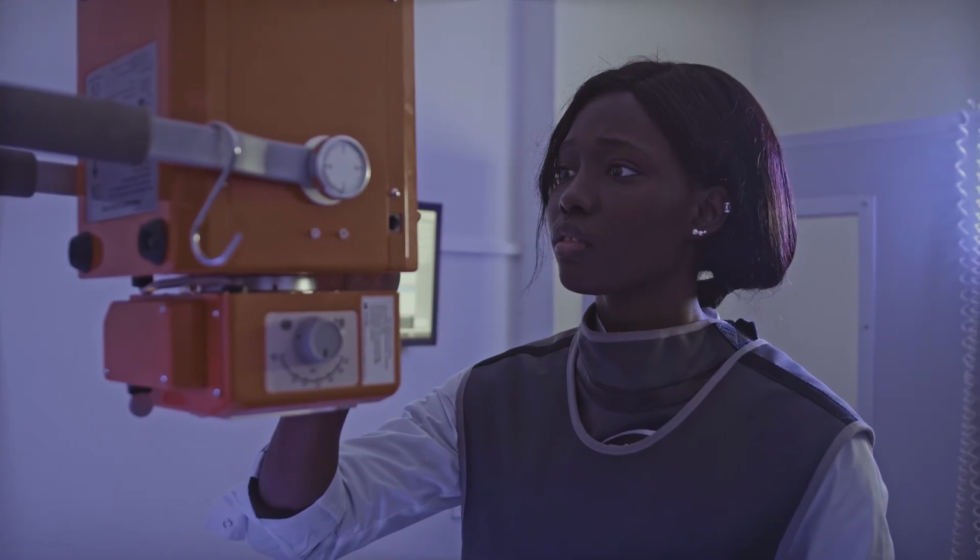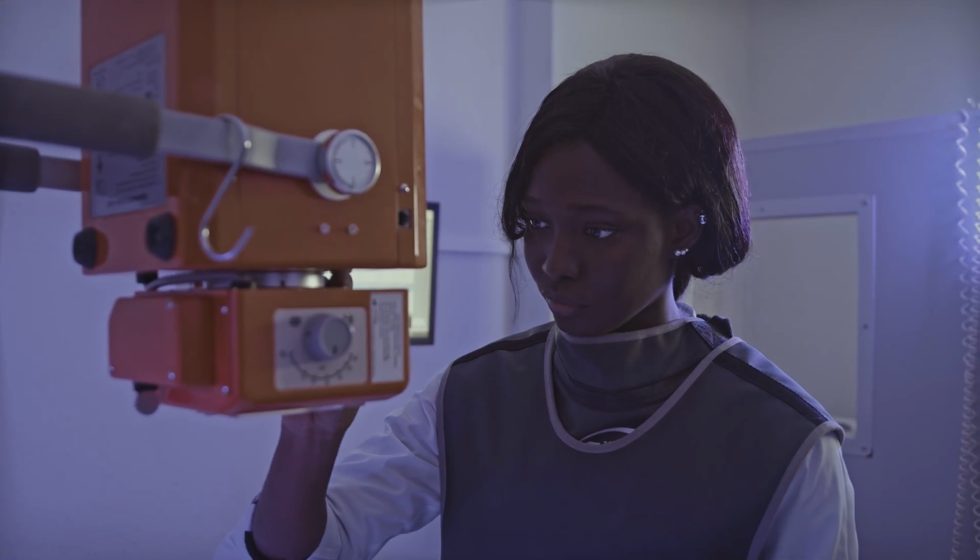In this video, I want to take a comprehensive, simple and practical look at the overall structure of a radiology machine. Here, we are not going to get into specialized explanations, complex parameters, or deep technical details, because for each component of the radiology device, we will make separate videos in the future, and there I will explain everything for you from A to Z.